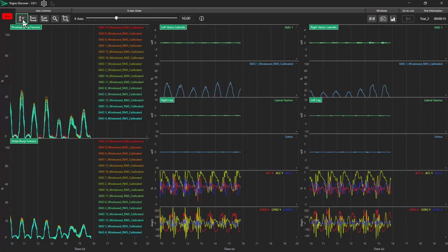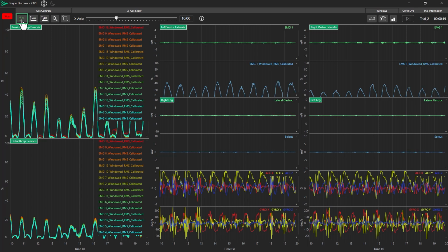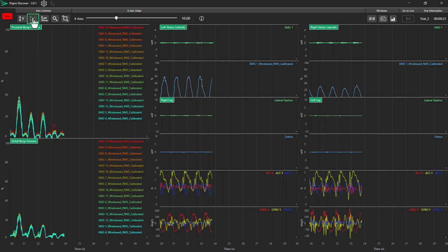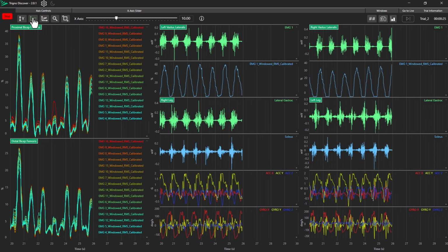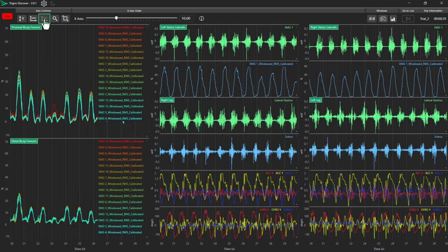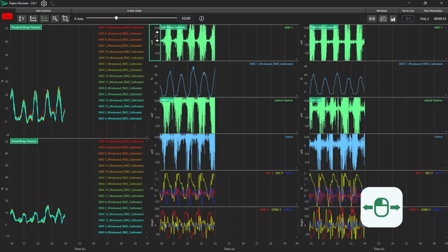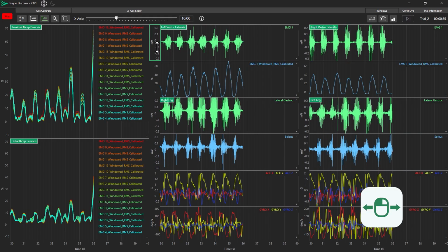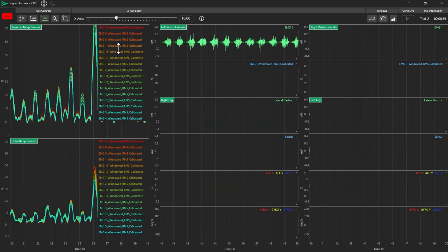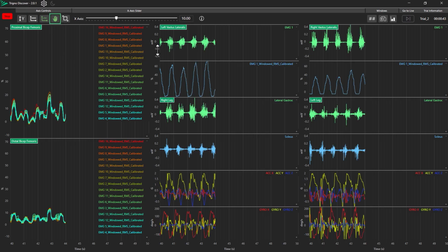To go to the Y-bounds for the data, click the Go to Y-bounds button. To automatically scale the Y-axis range to fit the data, click the Auto Scale toggle. The Link Axis toggle will link the Y-axis of all data channels of the same type. Clicking and dragging the Y-axis will zoom or pan on an individual channel. To change between zooming and panning, select the Y-axis behavior toggle.